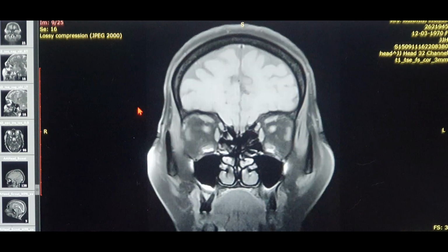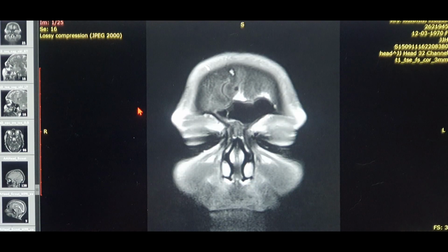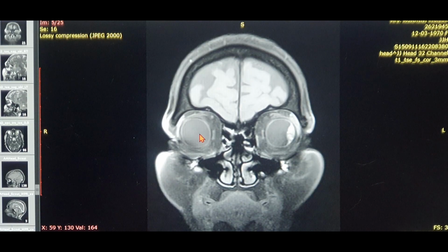First of all, you always have to remember the basic concept, it's just like a CT scan. When you order an MRI scan, it should be around 0.5 to at most 1 mm, and it should be in all 3 different directions: the axial scan, the coronal scan, and the sagittal scan. This we have is the coronal section.